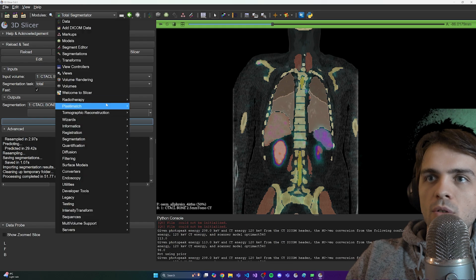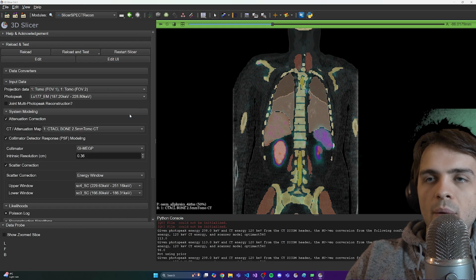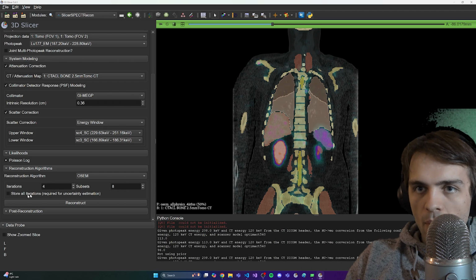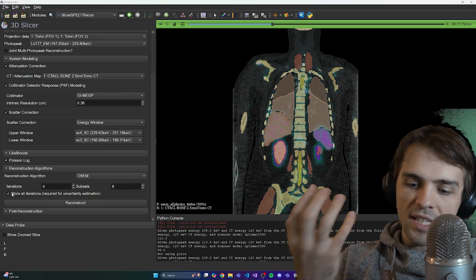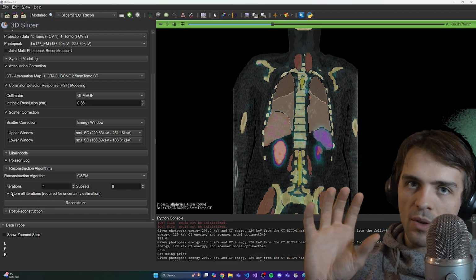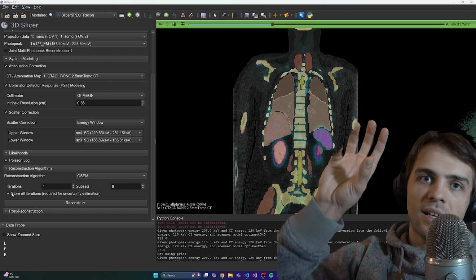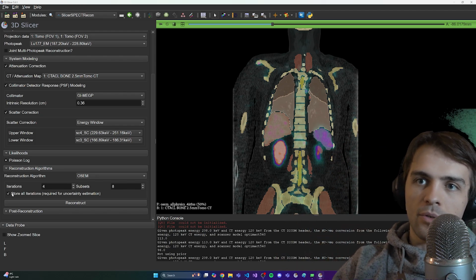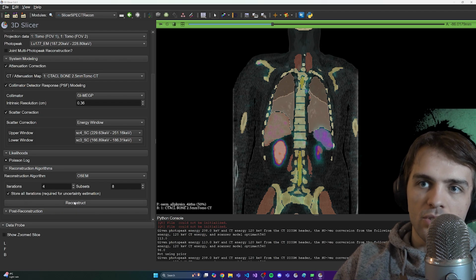So what I'm going to do is I'm going to go back to the SlicerSPECTRecon extension, and we're going to do one final reconstruction. We'll just do a regular OSEM, 4 iterations, 8 subsets. But what I'm going to do is I'm going to click this Store All Iterations. So in order to estimate the uncertainty, one of the things that you have to do in the algorithm that's written is you have to store sort of the update of the 3-dimensional image at each iteration in the iterative algorithm. So I'm going to store all the iterations. This is something you need for uncertainty estimation, and I'm going to click Reconstruct.